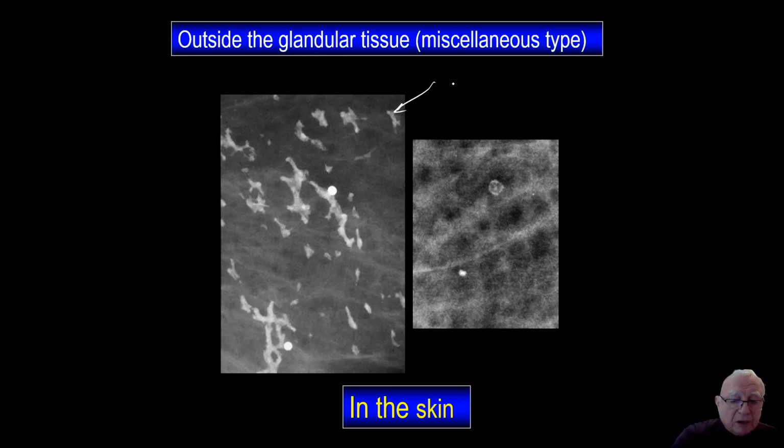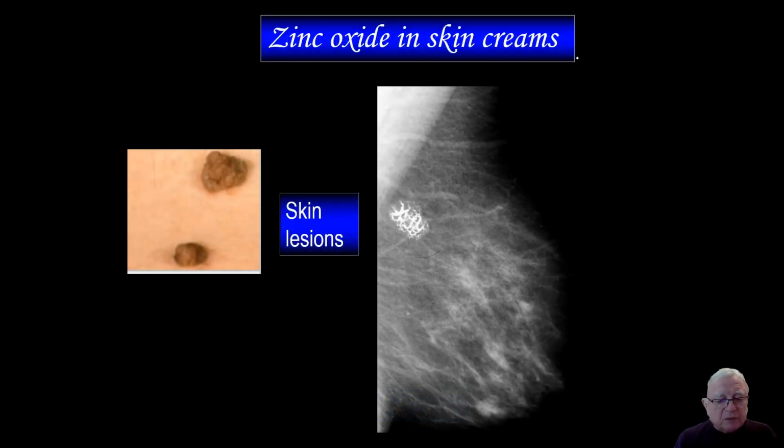Don't even call the patient back. We have skin calcifications belonging to the miscellaneous type. Don't call her back, please, from screening. Now comes an interesting practical advice.